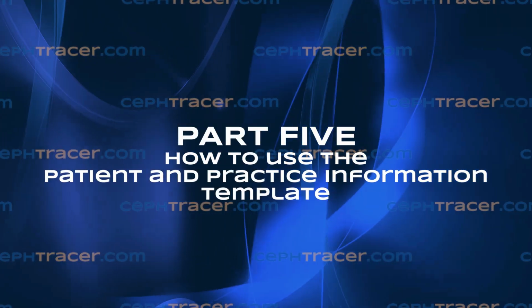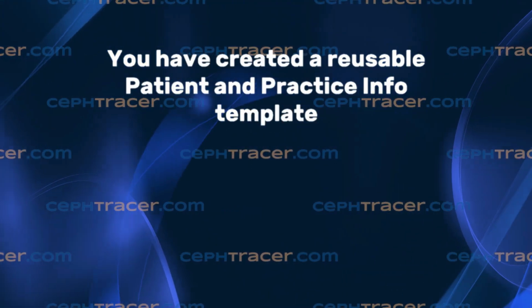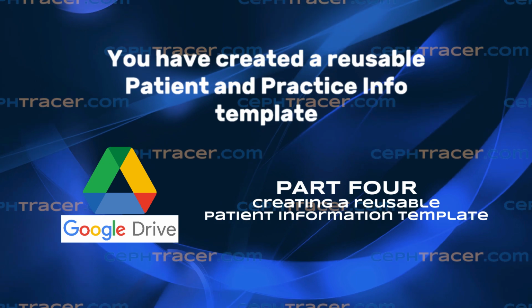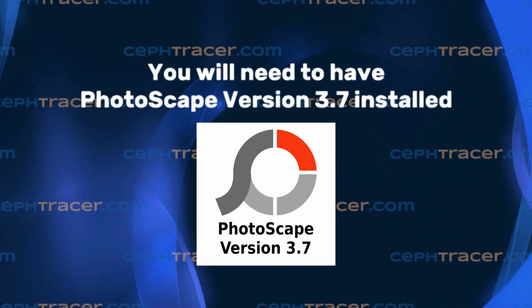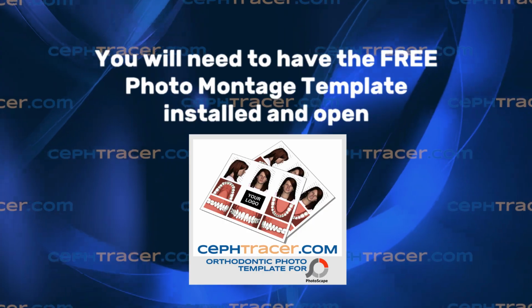Welcome to Part 5. How to use the Patient and Practice Information Template. This tutorial assumes that you have created a reusable patient and practice information template, as described in Part 4. That you have successfully installed PhotoScape version 3.7. And have also installed the free Orthodontic Photo Montage template.